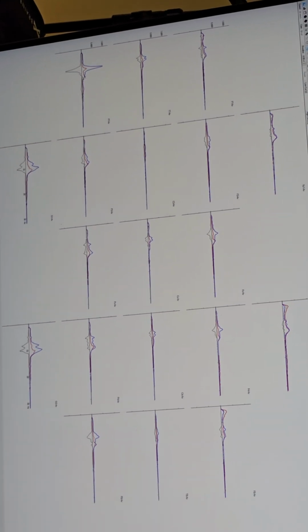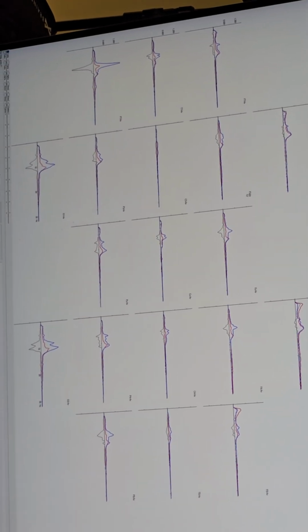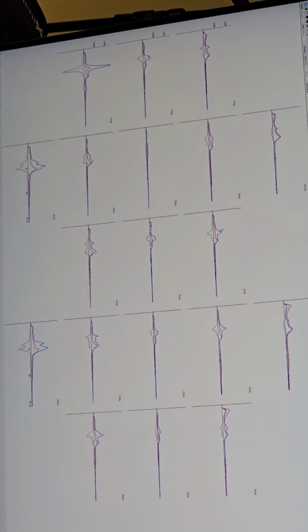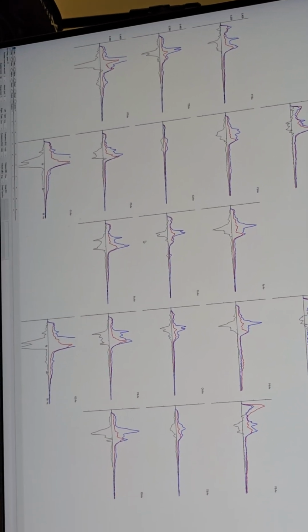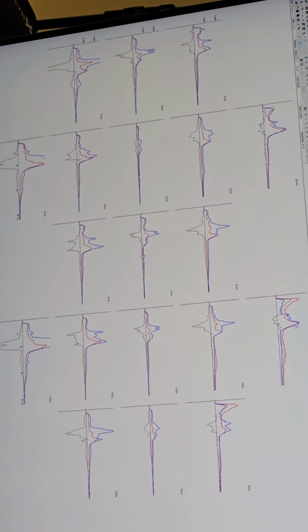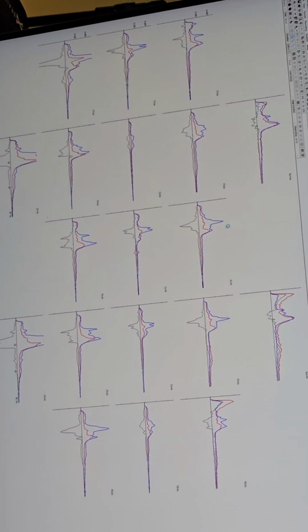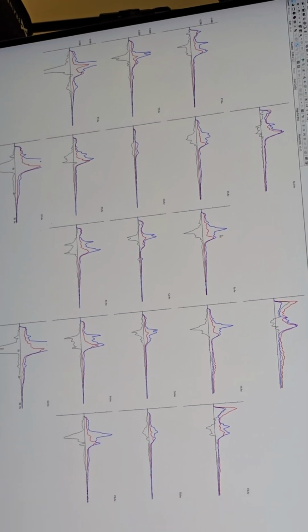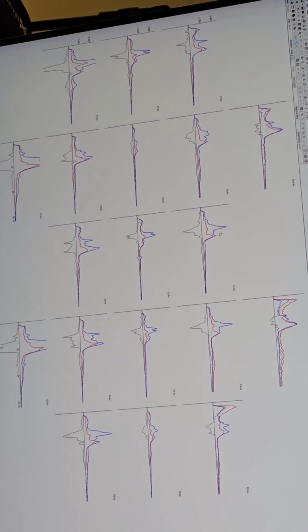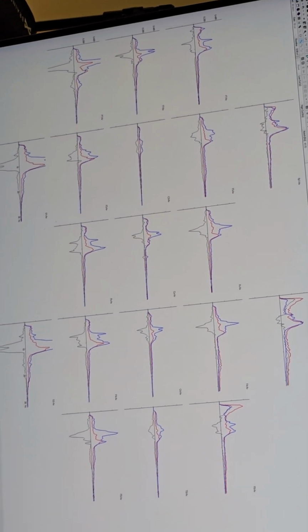So this, to me, is pretty significant. This looks like, when we did this EEG yesterday, your frontal lobe is starting to come online. I still don't like to see this much alpha. It's too much. And look, it even gets stronger when you get up to the frontal pole. That suggests there's still some frontal attenuation happening there. But at this point, I think we're going in the right direction because this has changed so much. Now, I can also show you the ERP.